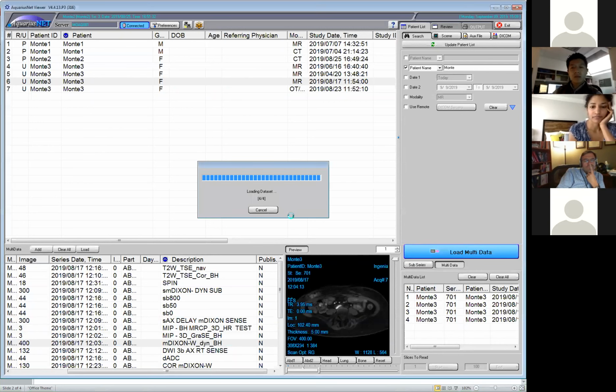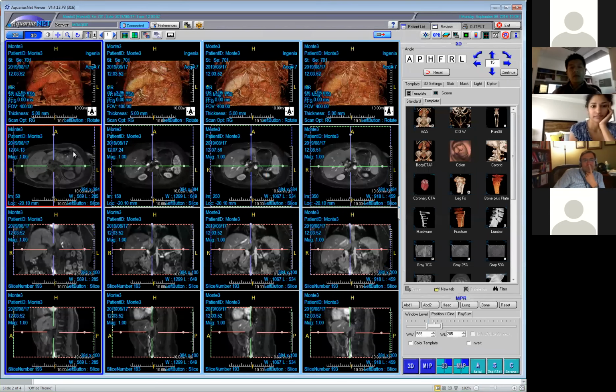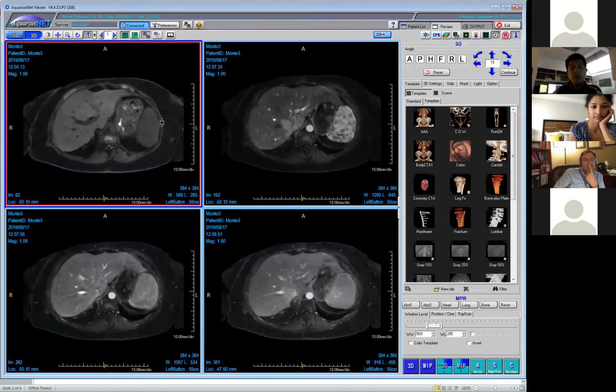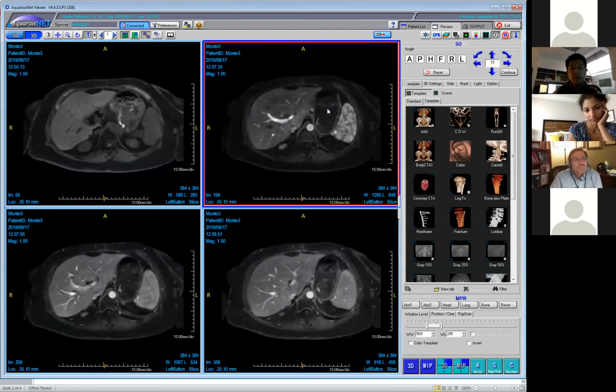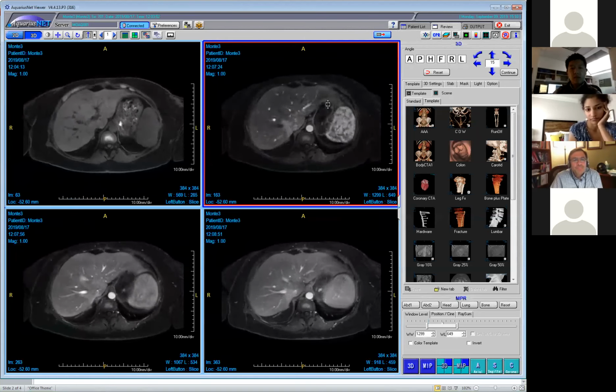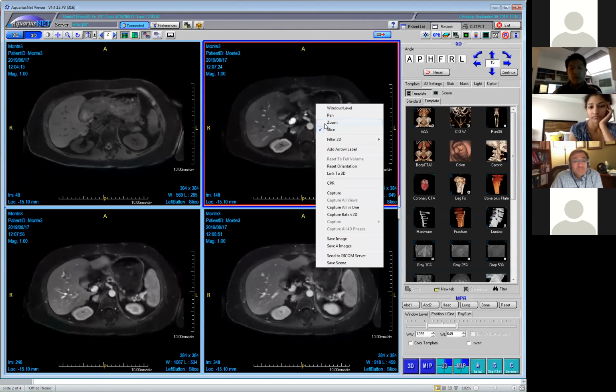So patient has history of biliary strictures, and they're following up on the biliary strictures. And this, again, this is orthotopic transplant. I won't show you the strictures, but the strictures were there. So as I was reading the study, I noticed this.